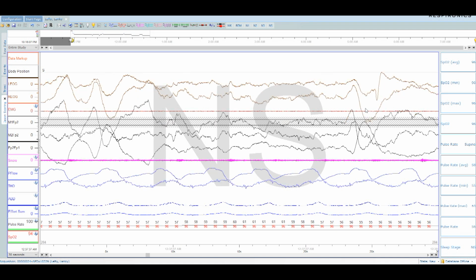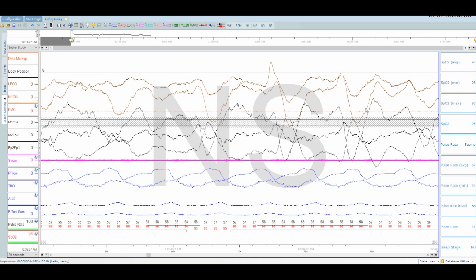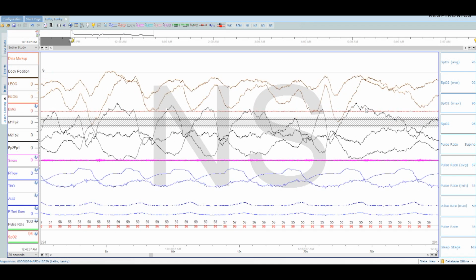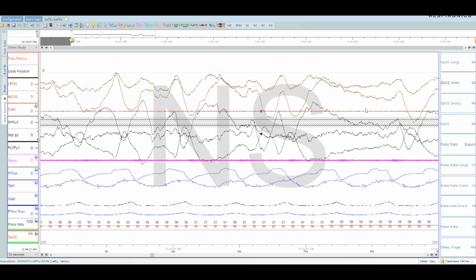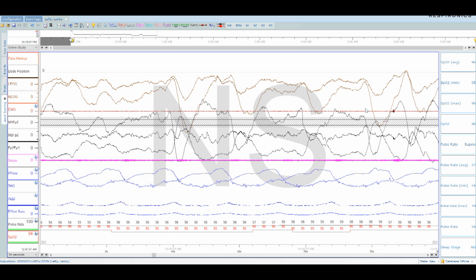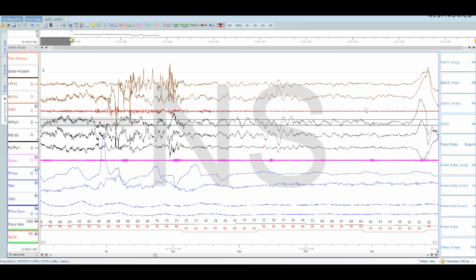This is really highly associated with muscle aches and pains. If people don't have N3, it's like the tissues are healing during this stage. People with fibromyalgia, you'll notice alpha delta waves, otherwise known as alpha intrusion, on top of them. And it's an affliction that I've noticed. Everyone who has chronic fatigue syndrome, any chronic muscular aches such as fibromyalgia, they tend to have that alpha delta sleep.